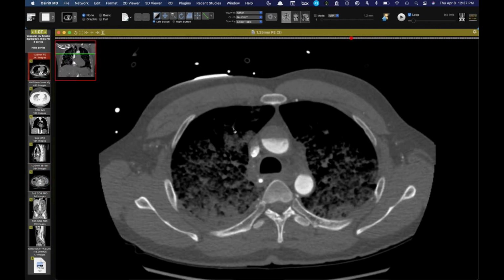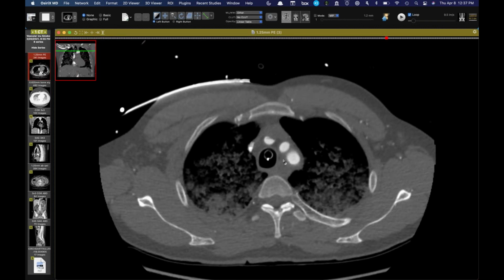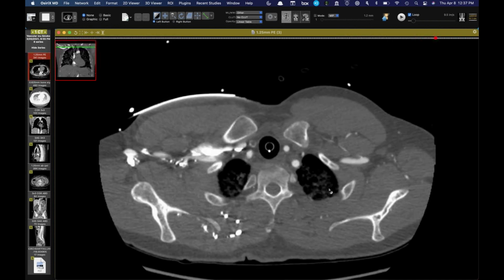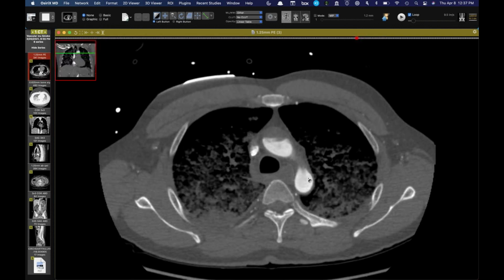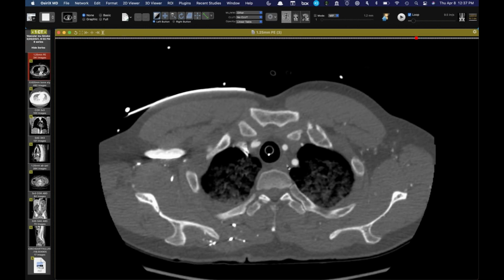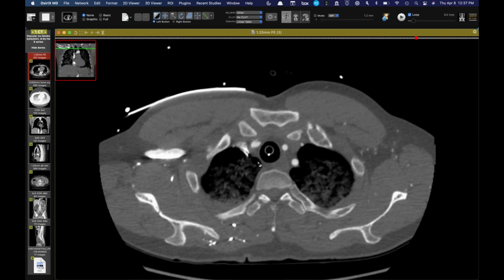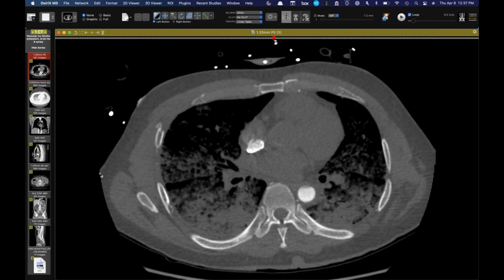So I show this because it's interesting. I've been reading about different patterns of ECMO, and in patients with veno-arterial ECMO like this, there is a risk of what's called Harlequin syndrome or north-south syndrome, or just watershed infarct. It's really competing, because blood should be flowing backwards in patients that have cardiac arrest like him. So he at least has some perfusion of his arch vessels, save the right carotid artery, which doesn't get much flow, because there's no competing forward flow from the left ventricle, since his heart's not working.